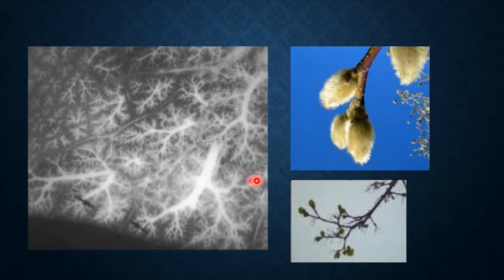Don't worry. So, again, this is a bronchogram. They pushed radio-opaque material, and you can see the bronchiole leading to the terminal centrilobular bud. When this gets opacified by pathology, it results in the tree in bud or tree in bloom appearance. This is normal, just opacified by contrast material.